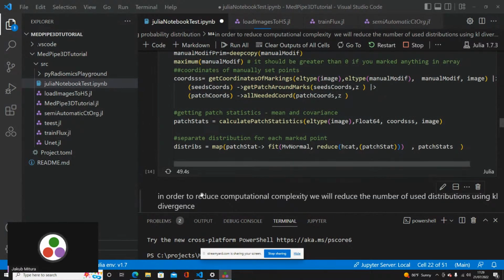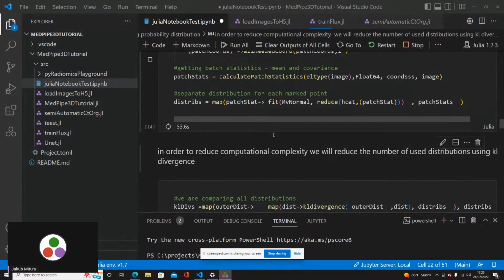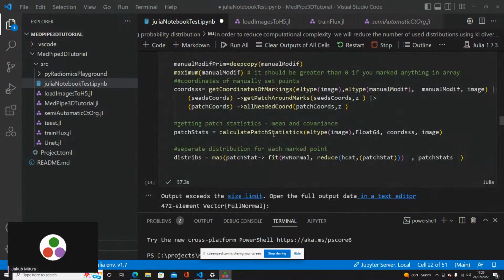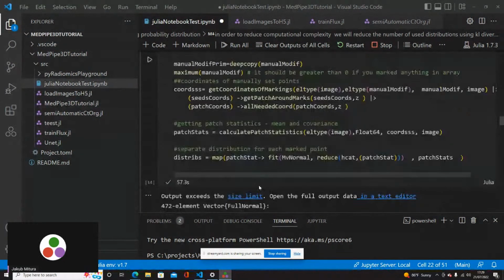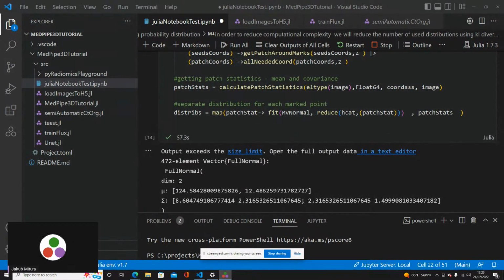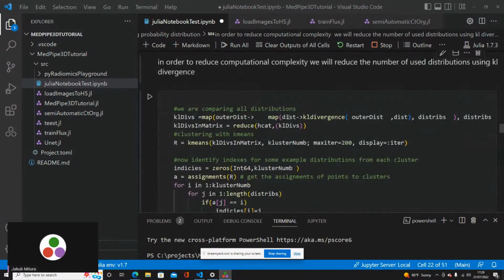That's why, when we execute this on the CPU, like now, it can take 2 minutes or so. We'll get to this in a moment. Yeah, now we have it. It took 1 minute on my CPU, without any parallelization, without any optimization, for a relatively simple task, but we have a lot of data. That's why it can be slow, and in this case, as I said, it's intentional.